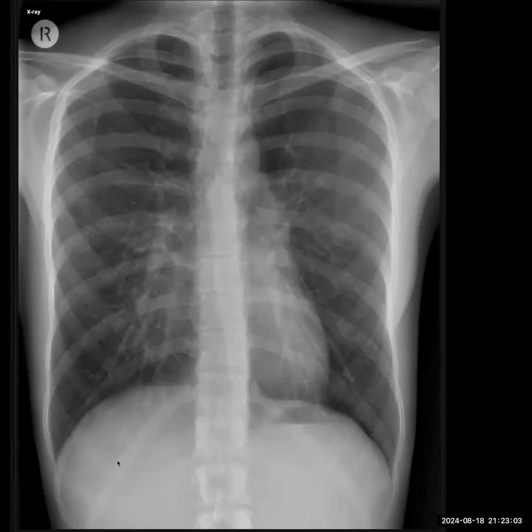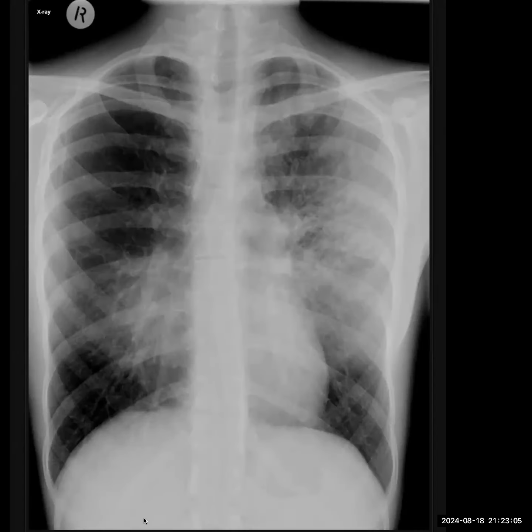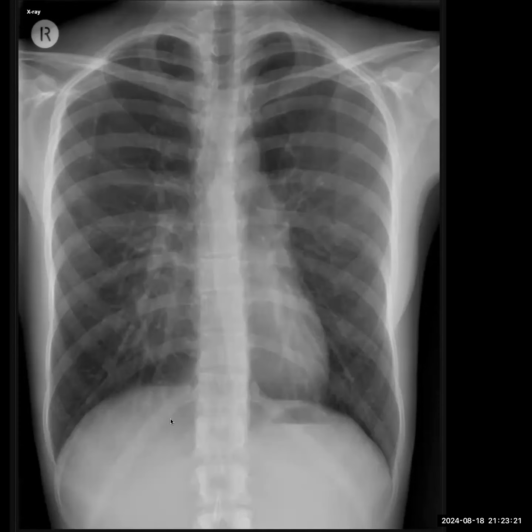Okay, then there is the next one. So this was a bit of a tricky case. This is the pathology, and I understand that you mentioned this is a pneumonia in the left upper middle zone, and you described that there is some right lobar pathology as well. But if you look at the post-operative, the follow-up image, you'll notice that there is still some haziness here.